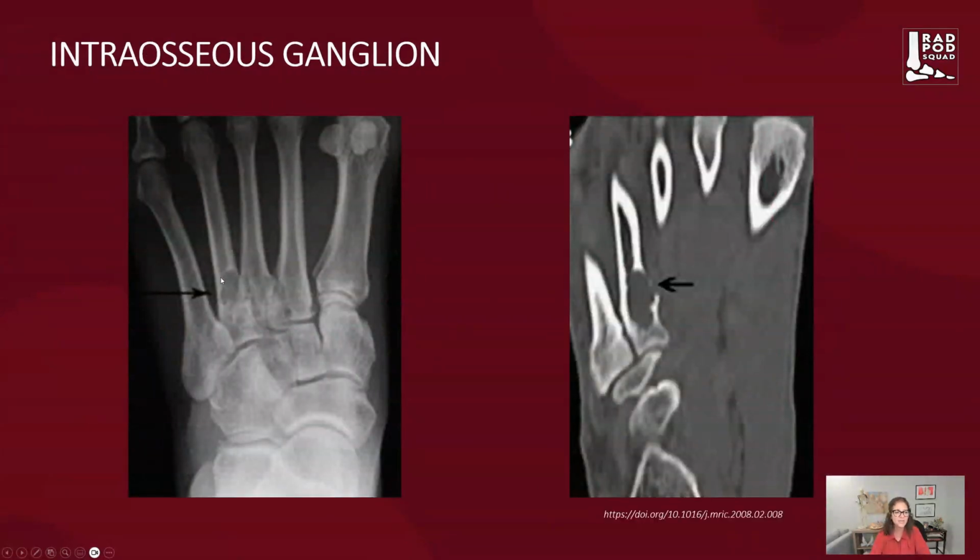Here we can see our intraosseous ganglion, our lucent lesion, and of course we have a CT that can help show us where we couldn't see this area of overlapping bones, where the base of the third overlaps. We can now see that on thin section slice CT as that small area of cortical fenestration in this patient who has an intraosseous ganglion, entirely benign. And you can refer further to these lesions for further examples. Just put that right into your browser.